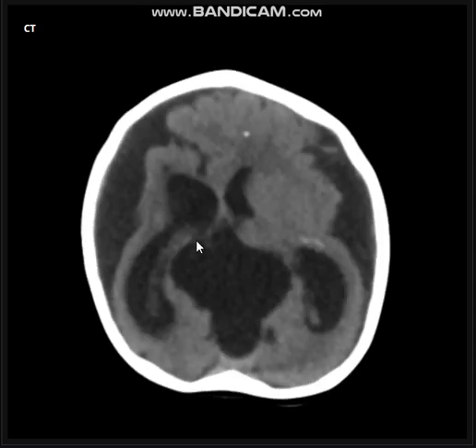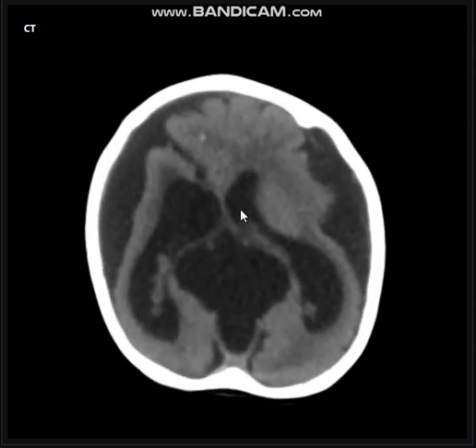which is the dysmorphic, disorganized appearance of the cerebral hemispheres, and the pachygyria-lissencephaly with scattered microcalcific foci, which are all secondary to TORCH infection. And actually, when we reported this, the clinician performed cytomegalovirus antibodies for the mother, which were positive. So that was a case of TORCH infection with cytomegalovirus, and that had led to the microcephaly.